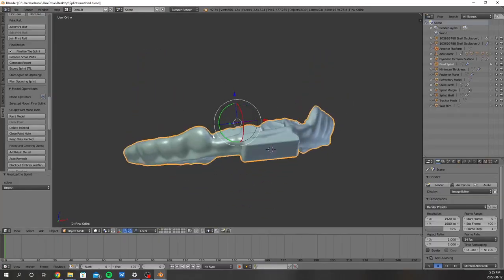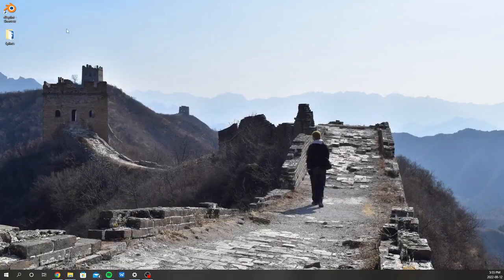And then that is it. Now that we're good with this, you just hit close. Good to go.